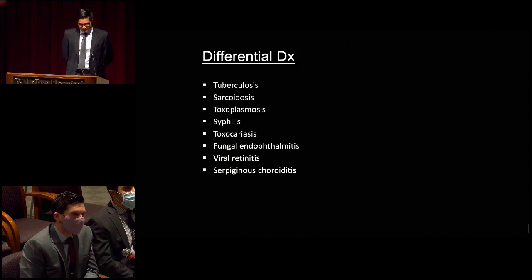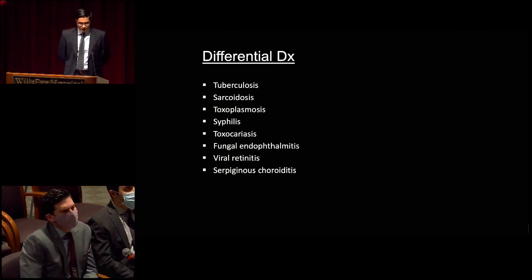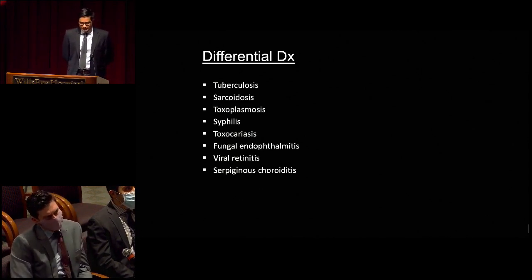Great, thank you. You hit on a lot of things we also considered. We also had serpiginous choroiditis on the list, given the juxtapapillary location, but the appearance of this lesion would be atypical for that. It's not going to be serpiginous choroidopathy because it's not a choroidopathy, it's a retinopathy. And serpiginous choroidopathy doesn't give you inflammatory cells, so you can eliminate that.